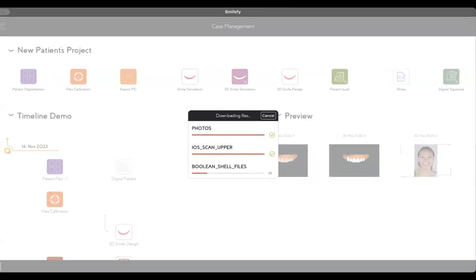But in the mesh editor, if you have a mockup, you delete the palatal area and leave only the buccal additive design. So the mesh editor is mostly to delete the extra excess stuff. You can do it in SmileFy too. If you turn the model to the occlusal plane and select a point in the occlusal view, then you can reduce this volume and then correct. But mesh editor has more stuff.